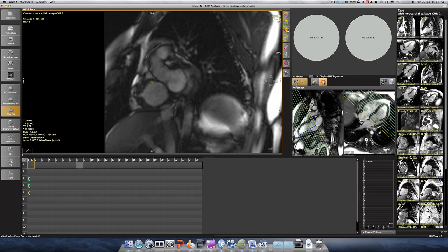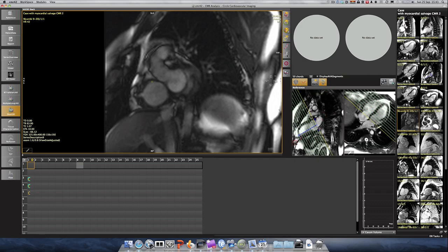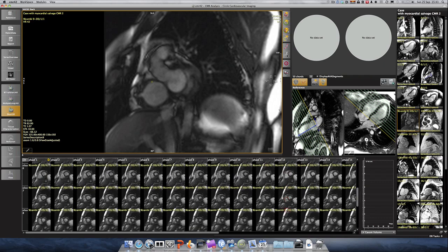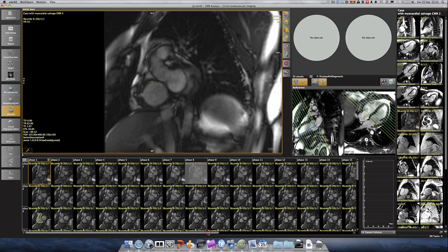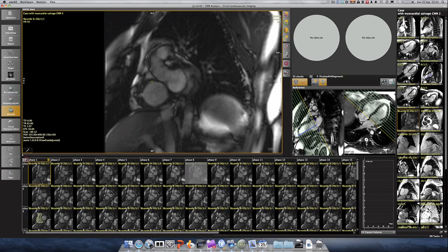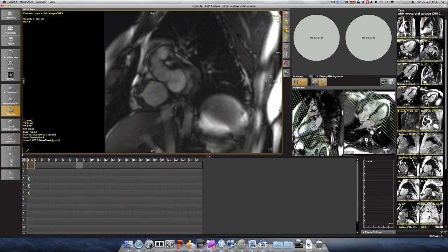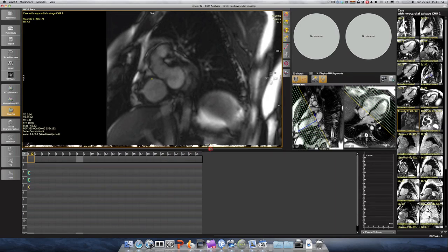And you can see that if I take this toggle off, which is the second plane of the mitral valve plane, then you only see one. But yeah, so again you can toggle here between your anatomical images. You see we've got 9 slices, 12 slices here. And how many phases have we got? We've got 25 phases. So I always prefer to see this schematic. I guess you can always change this slightly so that you can see the entire schematic.